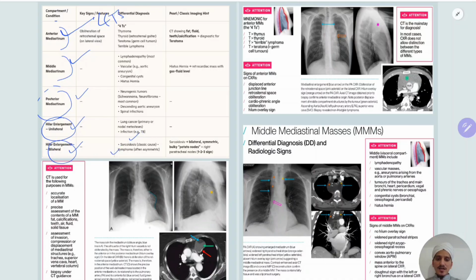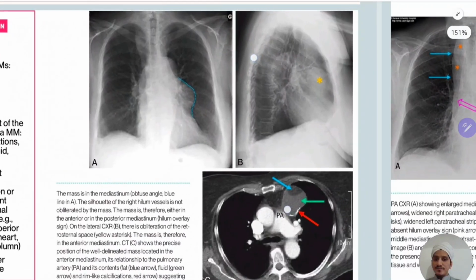Let's see the images of those, the signs of those in the chest X-rays and confirmation by the CT scan. Let's begin with the name of Almighty. So I need to wipe this theoretical part. So let's see the first one.